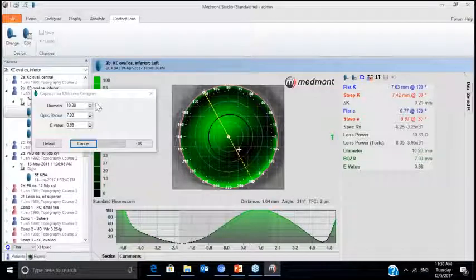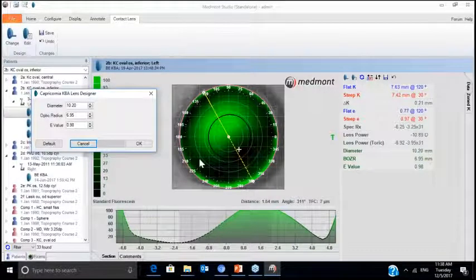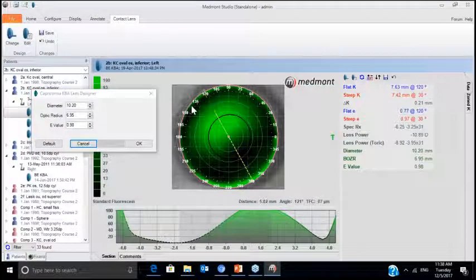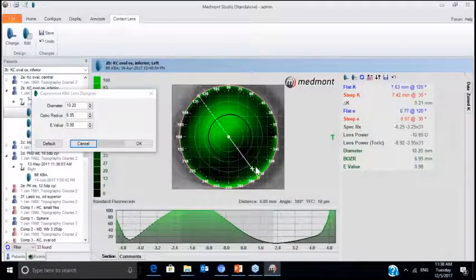In corneal GPs, patients often start to lose visual acuity when the fluid is thicker than around 40 microns, and we're at 61. So this contact lens is already far enough off the cornea on the visual axis that we might be concerned about a reduction in visual acuity.